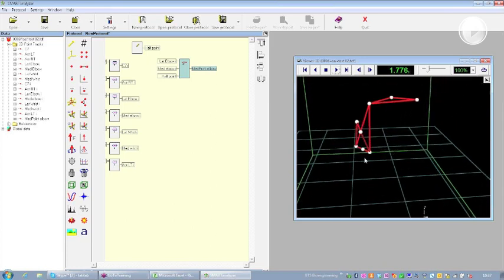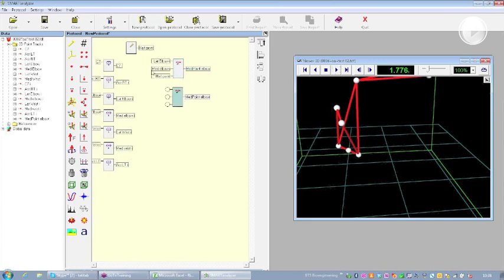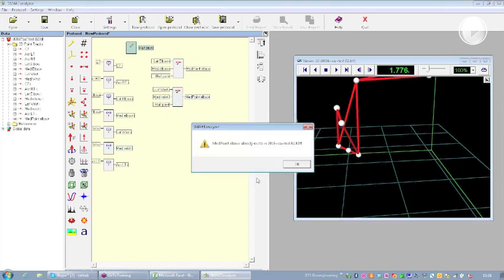Okay, I drag and drop this point that I just created. We can do the same thing between these 2 markers. So we copy and paste this operator, and this time we are going to use the lateral wrist, the medial wrist, and the same half point, because we still want to be in the medial point of the wrist.